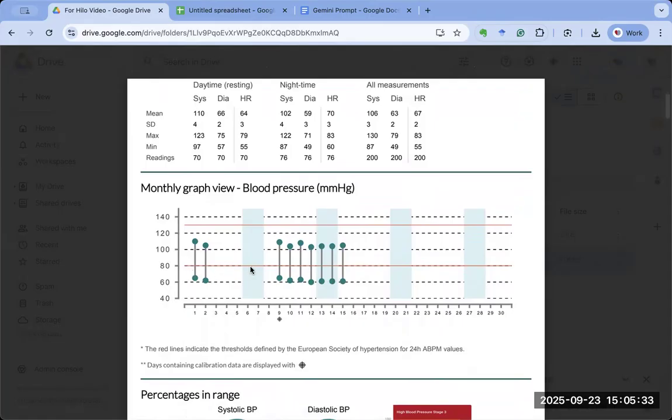So the person had taken off the device or it didn't record. Very likely they had taken off the device. So though the time covered is actually 15 days, the actual data is not 15 days, it's about 9 days. That is important to know because there is missing data for about 7 continuous days in between. So why is that important?